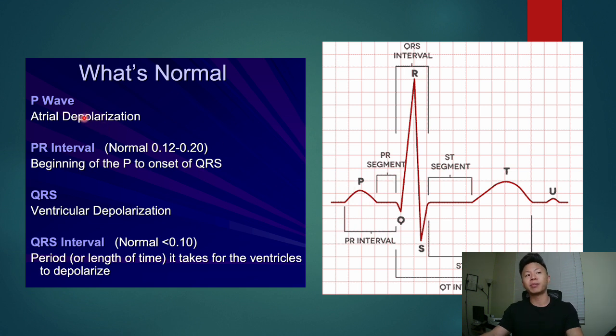So let's take a look at some of the components that you need to see in basically the most standard, basic things you need to find. All right. So we have your P wave to start. Right. We have your QRS, and then we have your T. I want you to separate those into three segments right there. So your P wave, right? Think about that as the top portion, your atrium. Your atrium contracting. One word for contracting in ionic terms is depolarization. So your atrium is contracting.